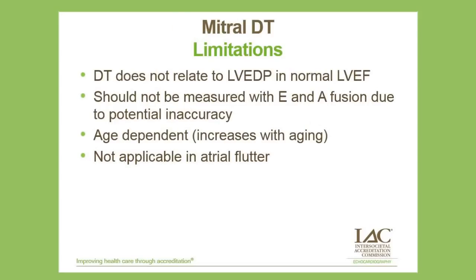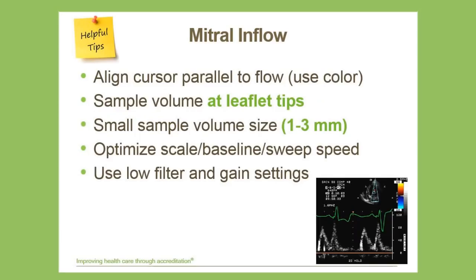The decel time also has limitations. Again, in a normal LVEF, it really does not relate well to the LV end-diastolic pressure. And you shouldn't be measuring decel time if you have E and A wave fusion because of the inaccuracies I just discussed. The decel time also is age dependent. Typically, we see the abnormal relaxation pattern and a lengthening of the deceleration time, and it is not applicable in atrial flutter.